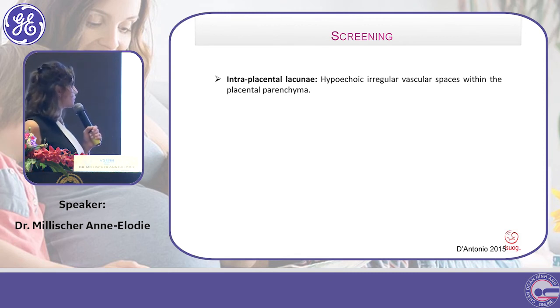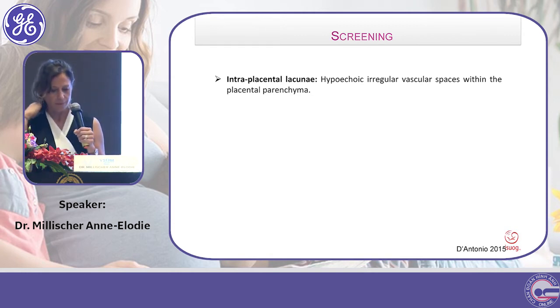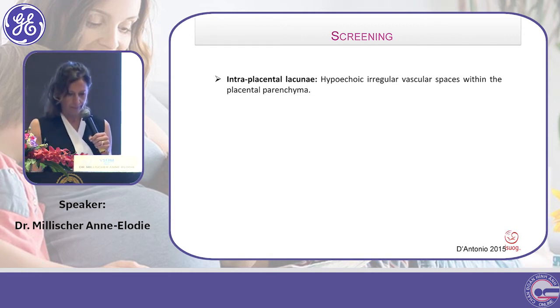Và khi mà các bạn gặp một cái trường hợp mà trên siêu âm mình thấy là có một cái sẹo mổ lấy thai từ trước, và có một cái nhau bám thấp thì khả năng cao nó sẽ dẫn tới một cái nhau cài răng lược.